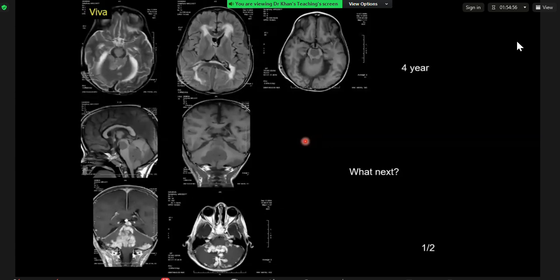There is some pontine involvement, so pontine glioma could be within the differential. However, normally it doesn't involve the ventricle in the same way that this does, and also doesn't normally have dural or CSF seeding. I'd be interested to see on CT whether this was hyperdense or not.